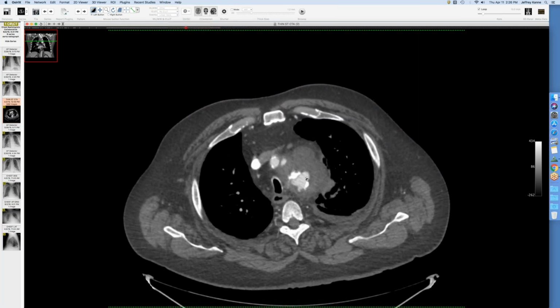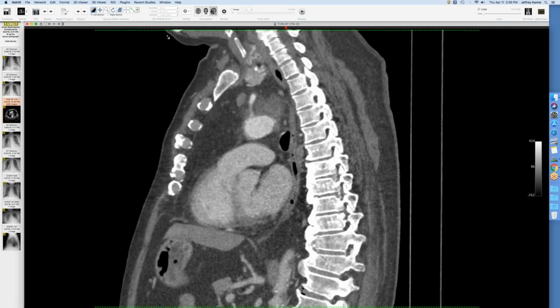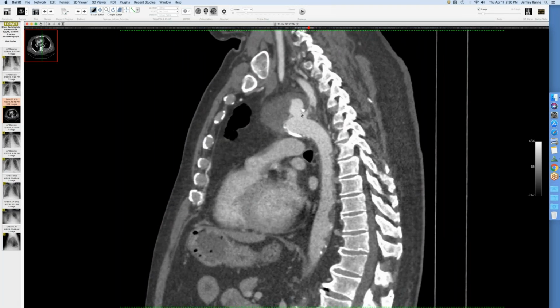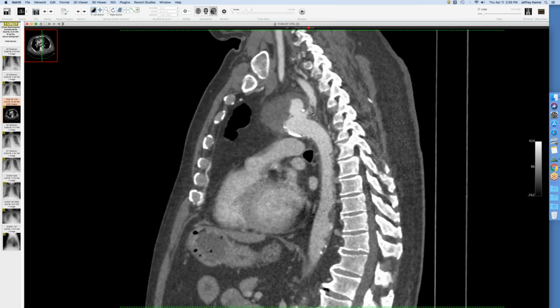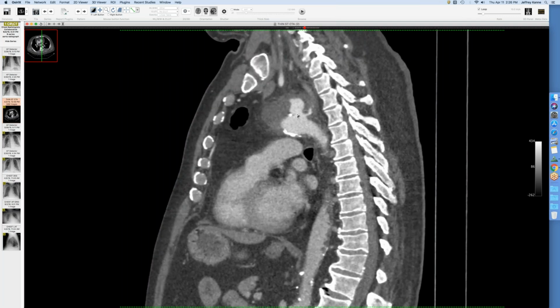So they ended up treating this with a stent graft. And the question was, was it a pseudoaneurysm, an aneurysm? I don't know the answer to that. I don't think I can tell. I think it's maybe a ruptured atherosclerotic ulcer, given that there's plaque on both sides of this little collar here. And then you can see a little bit of involvement. There's this thrombus in the subclavian artery there, and another plaque at its origin too. So I suspect this was an atherosclerotic plaque that ruptured.